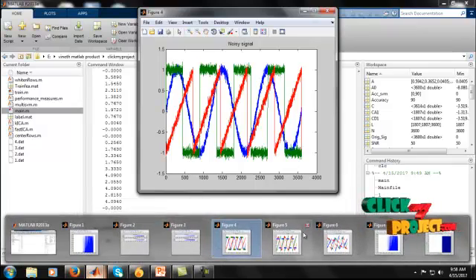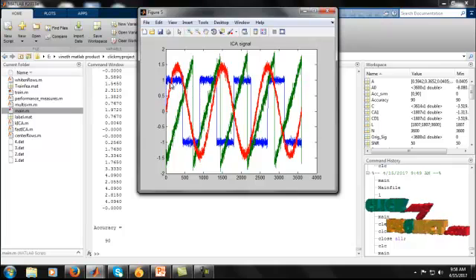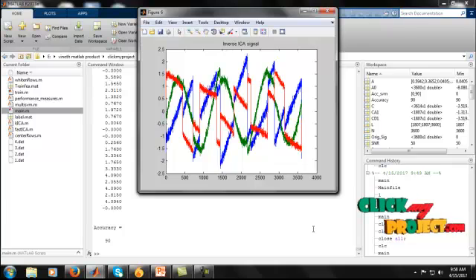Next we have to find the ICA signal. It is going to convert our input signal into a square wave, and the other signals are sine or sawtooth waves. So it is going to predict our input signal. So we have to apply the inverse ICA in our process. In the inverse ICA, it is going to get our input signal as a sawtooth waveform, and the others are sine wave or sawtooth wave.